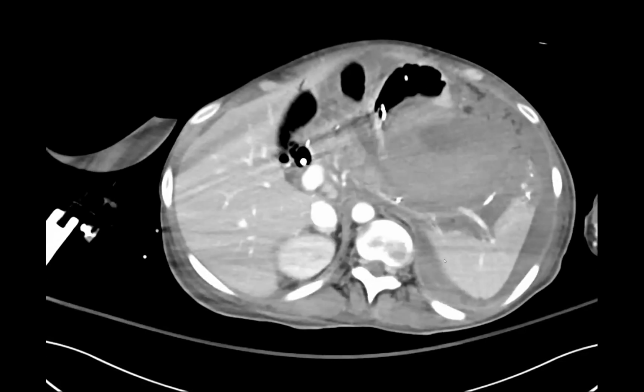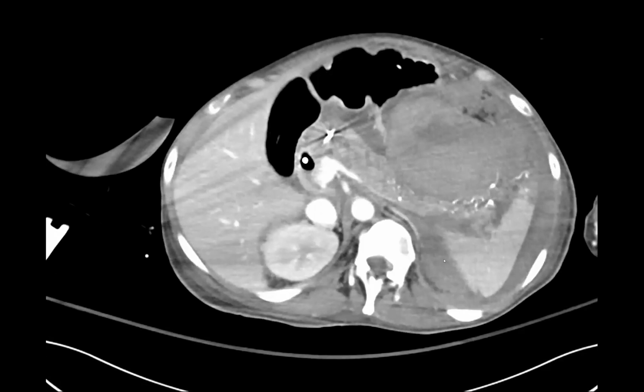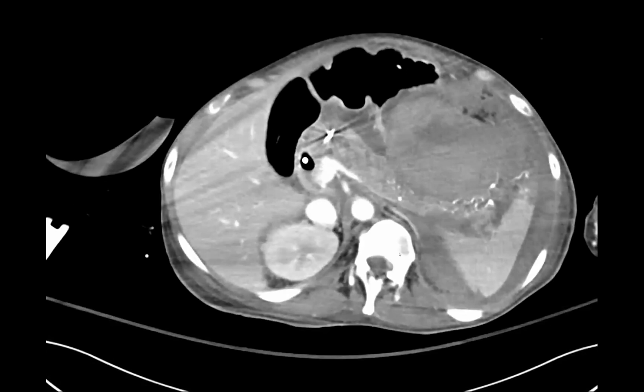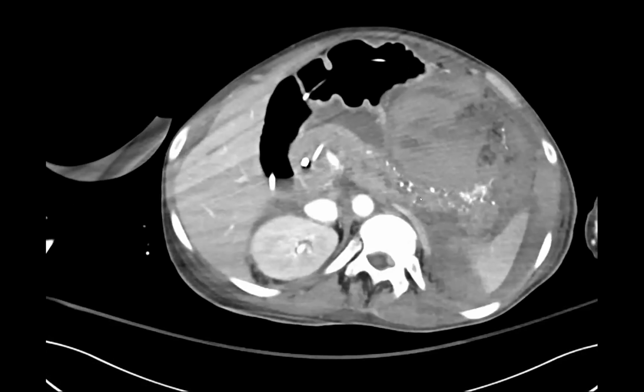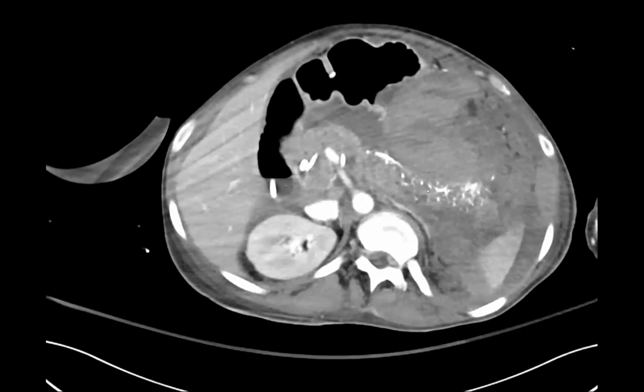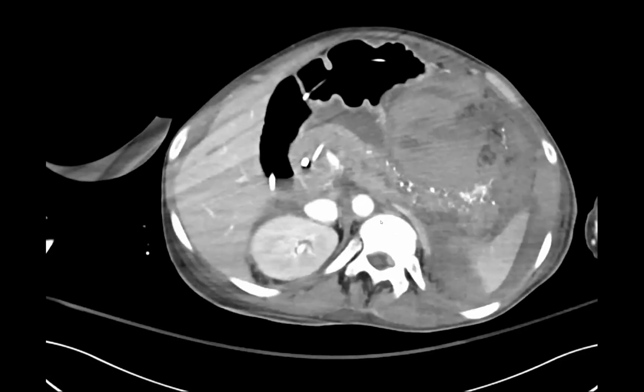Is there some sort of fistula between the arteries and the duct or something? Oh, good. That's a great thought. That is not what is happening. And actually, I'll show you. The duct is back here. When I initially looked at this, I was like, okay, stippled calcifications in the pancreas. I didn't look that closely. They likely had chronic pancreatitis, and they also have a liver transplant, so maybe this is all connected, related to alcohol. Don't know. But if you look a little closer, I'll just tell you, these were not calcifications and it was not a fistula with the artery.